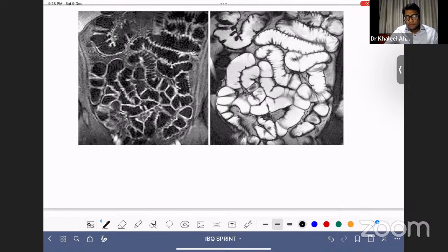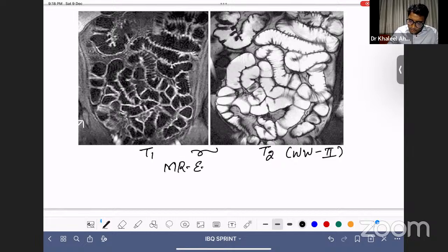And how are the bones? Let us see the bones. Can you see the hip bones, right? The pelvic bones, they're all dark, right? You don't see any white bone here. And can you see the fluid signal also changing? These are T1 weighted images and these are T2 weighted images. We all know water appears white on T2. So these are MR enteroclysis. This is MR enteroclysis.